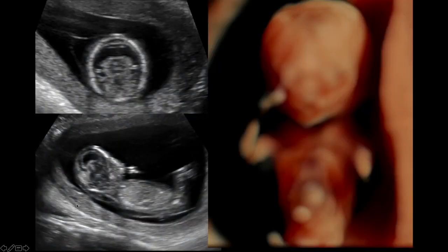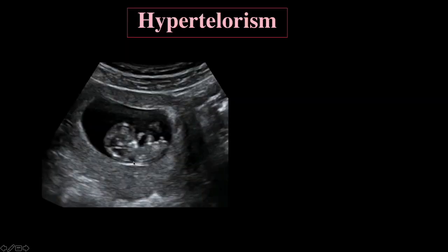Here's another case of hypotelorism in a fetus with holoprosencephaly. It's usually when you see it. And you have the monoventricle here. And basically you have no nose here because you've got a huge cleft in the middle here, and then the eyes are actually quite close together. So this is really a hallmark. If you can identify an extra digit here, that's going to be trisomy 13 until proven otherwise without any question.